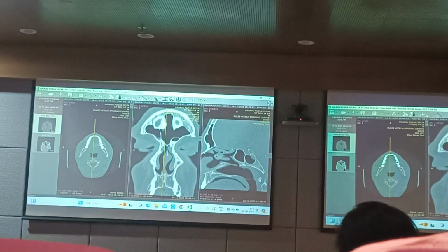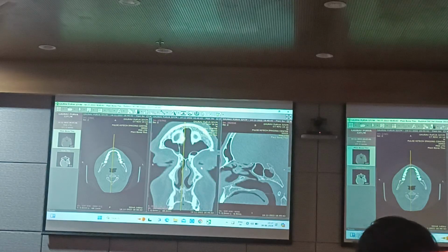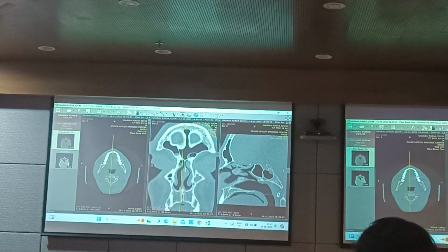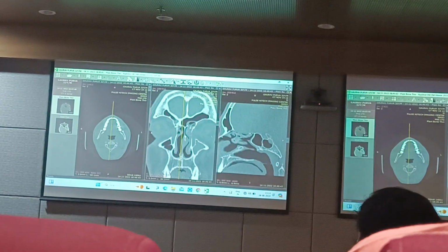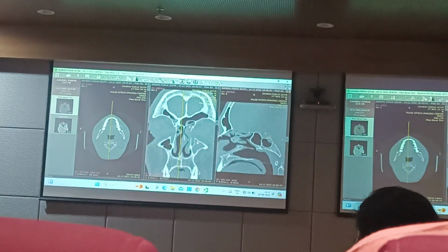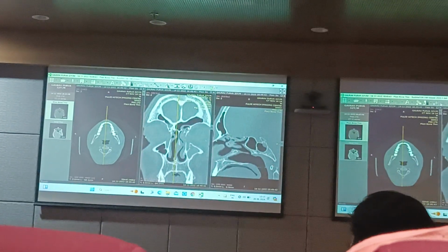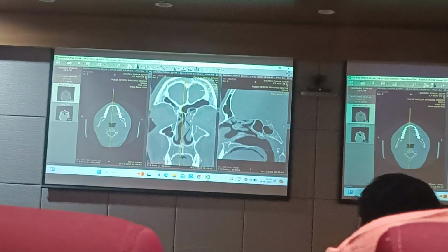You saw this very highly pneumatized sinus, right? You're seeing it over here as well. Now, once I go here like this, posteriorly, what else can you see now? What is this? Nasolacrimal duct. Good. What is this now? Bulla ethmoidalis. Yeah, bulla ethmoid.